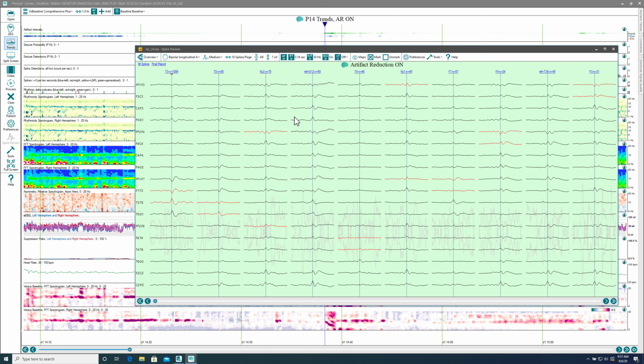In this case, we see that there are 1,099 of them, the vast majority considered maximal at T3. And you can see the averages of the spike detections. In Persyst 14, we also have a new way to mark spikes manually. Any spikes you mark manually also appear here in the spike review summary in their own groups.